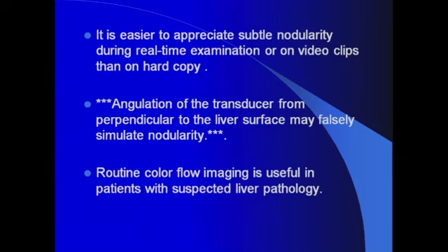In addition to that, you always should include color Doppler evaluation of all your patients suspected of liver pathology. Now, this is very important. Most of the exams that come to you for evaluation of patients with liver disease will be ordered as right upper quadrant without Doppler. You really don't have to have a Doppler order by the clinicians, because most clinicians in practice, specifically primary care physicians, are not aware of specific Doppler study requests for their patients. So the most common exams that are going to come your way will be orders for right upper quadrant.